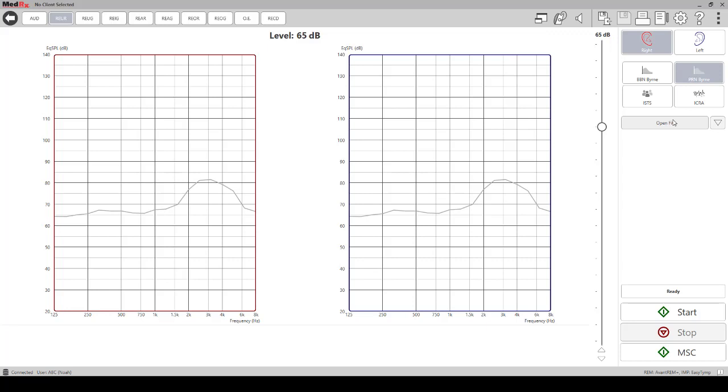To overcome this problem, the software offers a special way to calibrate the current stimulus for the current level and microphone position with the hearing aid turned off or removed from the ear. Then run the test in substitution mode without auto-level compensation. The system will store open-fit calibrations for future measurements.